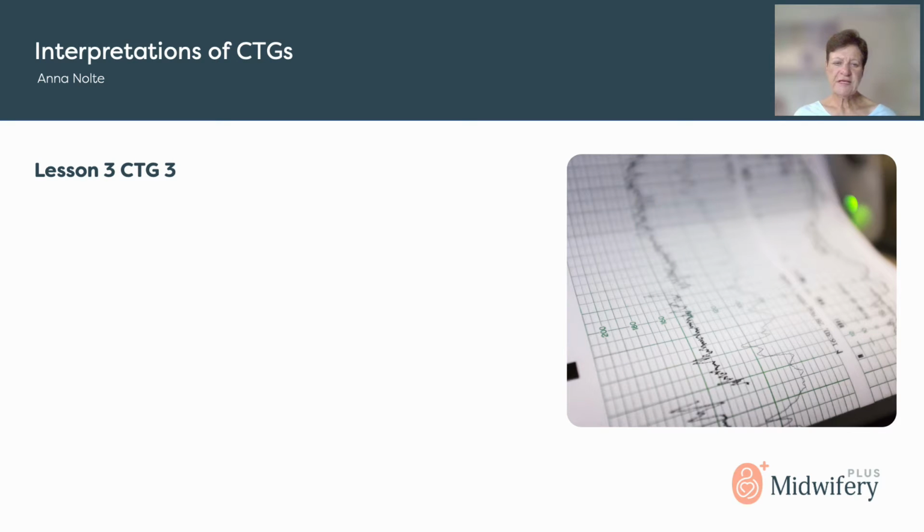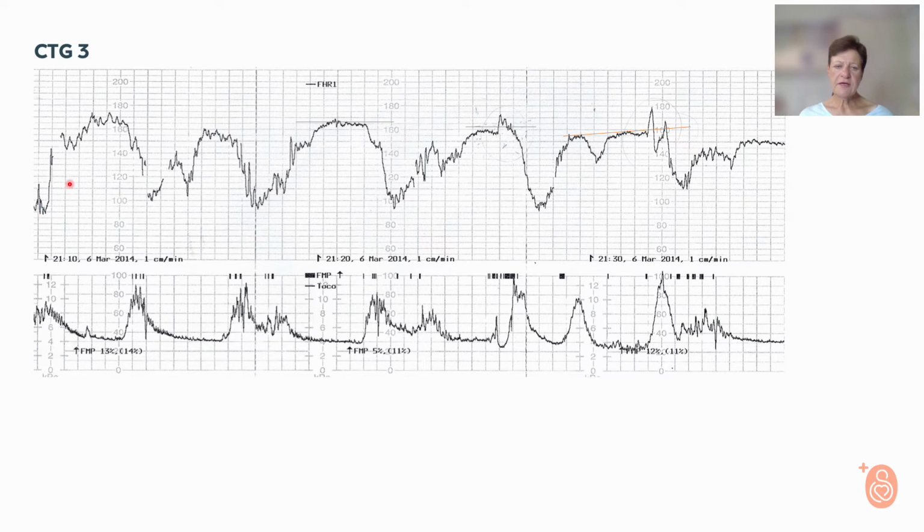Okay, and this brings us to lesson 3, or our third CTG, to analyze and to interpret. And again, like all the previous ones, I really hope you enjoy it, and I really hope that you learn something new. Now here in front of you is CTG number 3 that we need to analyze and interpret.